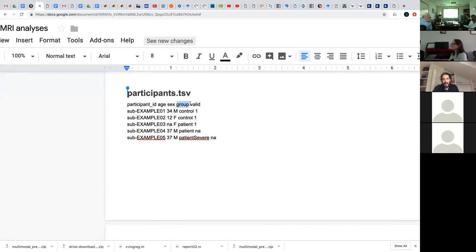If you enter them in here and they are converted to numbers, the difference between level 1 and 2 is assumed to be relatively similar to the difference between level 2 and 3, because the analysis is going to look at those 3 groups. It's going to put the first group at 0, the second group at 1, and the third group at 2, and it's going to try to fit a line through these clouds of points at these 3 levels, right? So you are assuming that there is a bit of continuous gradation between 0 and 1 and 1 and 2. If the difference between 1 and 2 is conceptually much larger than the difference between 0 and 1, then you don't want to use this type of ordinal analysis.